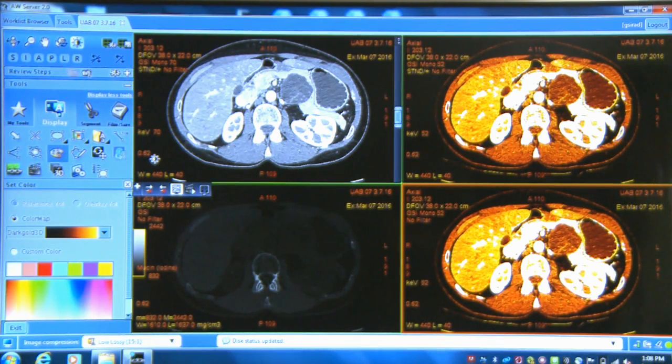So I hope you've enjoyed this trip using the GSI server, looking at how it does things differently. We can't use the color in PACS, but don't be afraid to use the dual energy images in PACS. If you're going to be looking for lower energy images or iodine images, you can program them to come straight off your CT console into your PACS and then use the server or the GSI workstation to your advantage when you need to delve more deeply into the dual energy information.